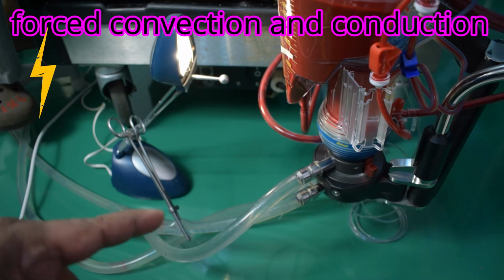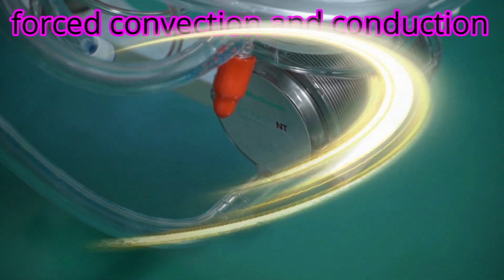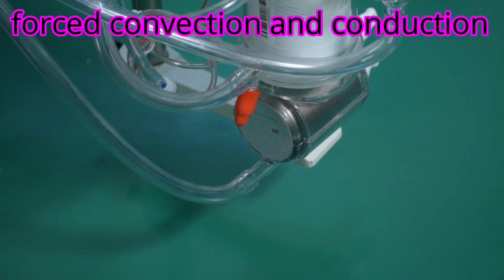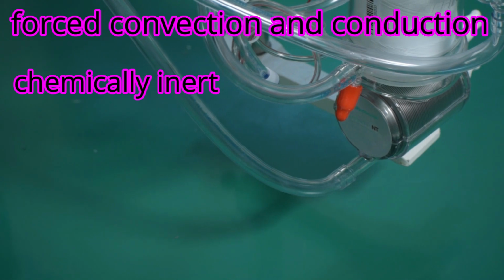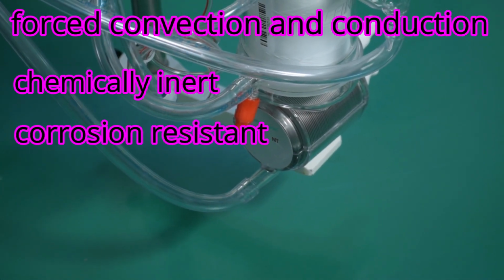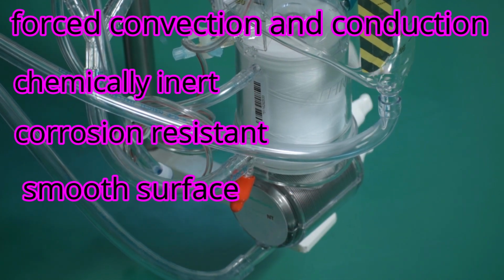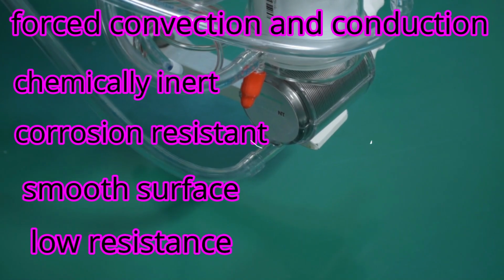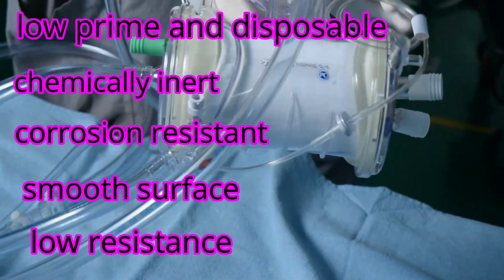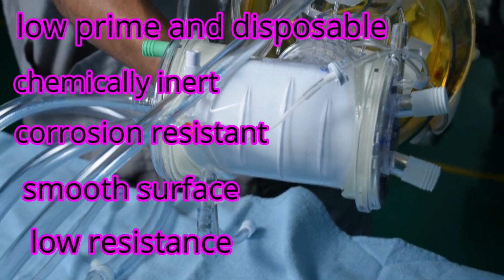The majority of heat transfer, as said before, occurs by conduction or convection. Therefore, all heat exchangers for the cardiopulmonary bypass circuit possess a high degree of chemical inertness. They are highly resistant to corrosion. They have a smooth surface. They have a low energy surface where RBC and plasmatic residues do not adhere. They provide low resistance to blood flow. They require very small volume to prime and are disposable.